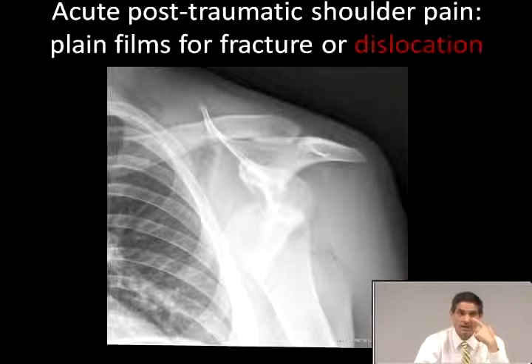The one important thing to think about is that you need some sort of axillary view of the humeral head to see some of those other dislocations. A straight posterior dislocation could be devilishly difficult to diagnose on a frontal film. So that's something to keep in mind when diagnosing shoulder dislocations. Here the arrow shows you the anterior-inferior displacement of the humeral head relative to the glenoid.